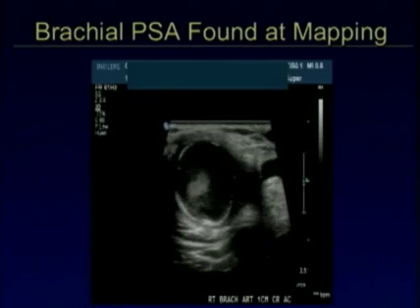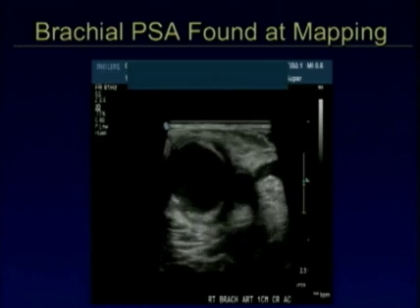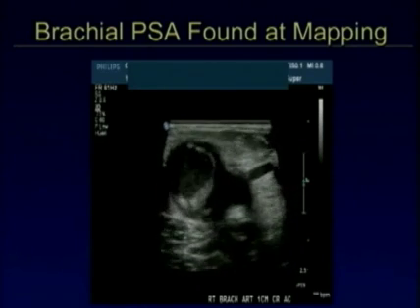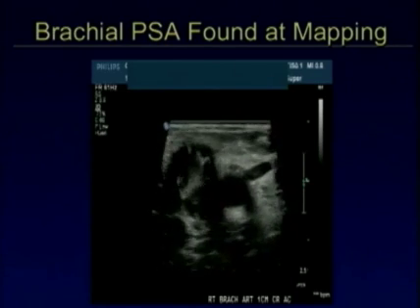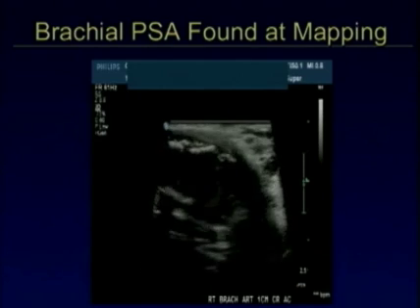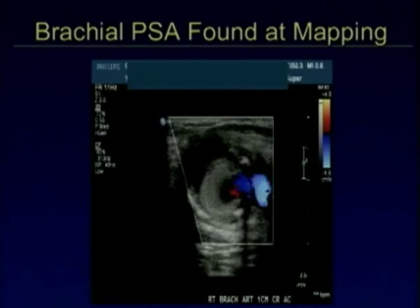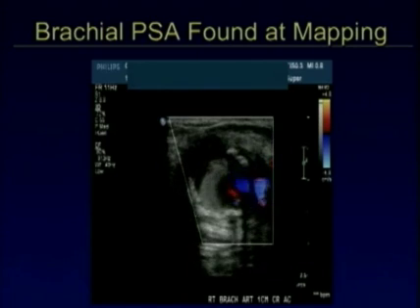This is another odd pseudoaneurysm. It's a patient that we were mapping for a dialysis access, and they had a brachial pseudoaneurysm. You can tell that it's old because there's some calcification around the periphery here. This pseudoaneurysm is likely from a prior needle stick or maybe a line. And you can see this is a typical pseudoaneurysm. Again, remember when you're describing the pseudoaneurysm, talk about the entire surface, measure the entire volume of the pseudoaneurysm, not just the patent portion. That's going to be important at surgery.